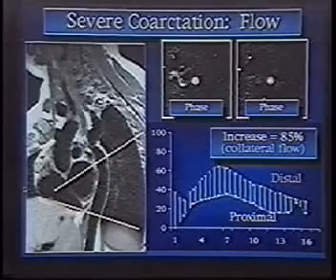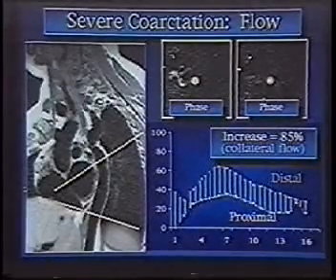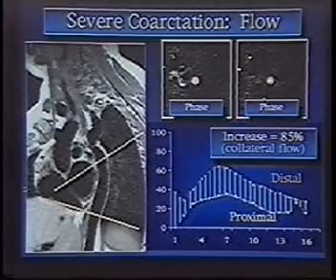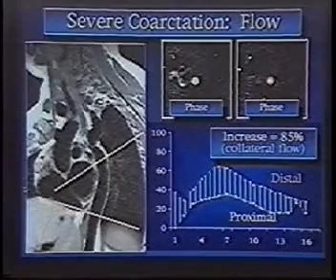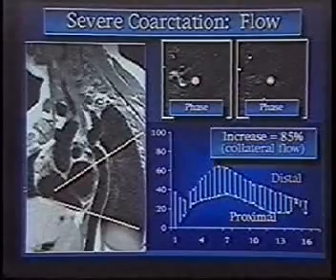I think I'll finish up with that. I hope that was a quick review of different applications of cardiac MR, primarily based on the cases that you might see as opposed to plodding through technique, which is, I think, pretty uninteresting.